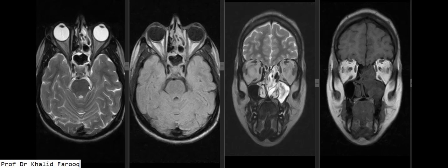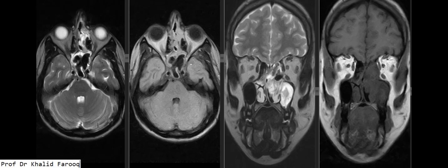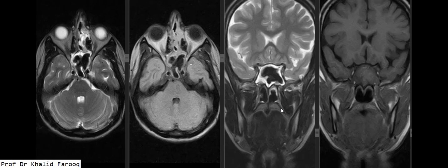We can also see paranasal sinuses on MRI. Here we have T2 axial and FLAIR axial sequences, and here we have T1 and T2 coronal sequences. We can clearly appreciate there is ballooning of the ethmoid air cell because of a disease component in it, but we can clearly appreciate that the medial rectus shows normal signals with normal surrounding fat planes. Similarly, low signal intensity shows proteinaceous component and calcification with manganese, which are paramagnetic, and show low signals, hypointense on fluid weighted sequences, and this can be confirmed on coronal T2 weighted sequence as well.